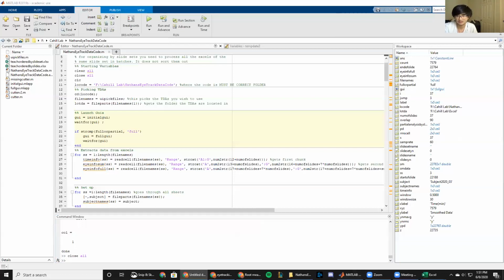And that is about it, that's basically all you need to know for the full analysis. Basically, the full analysis just graphs the data. That's why you would use it. If you want to figure out graphs, mostly I was using this so that if you wanted to see general trends or something, it would be easier. It's basically to visualize all the data. That's why we do that. I would imagine usually you would just order it by slides and do the partial analysis. That's probably enough for most of what you want to do, but I want to give you some flexibility of what to choose.